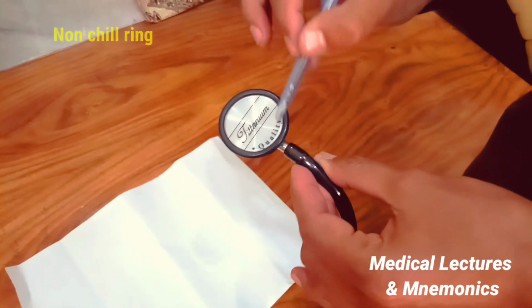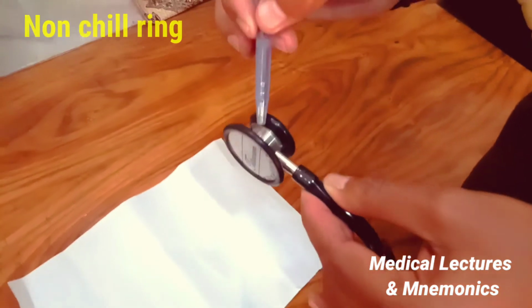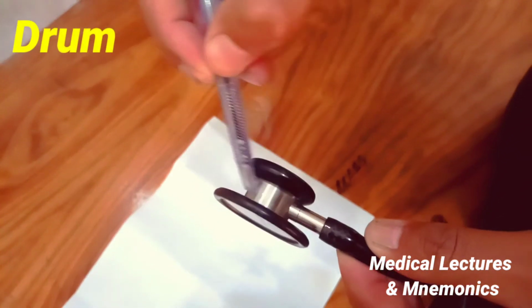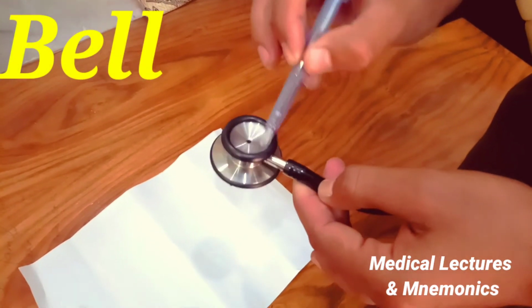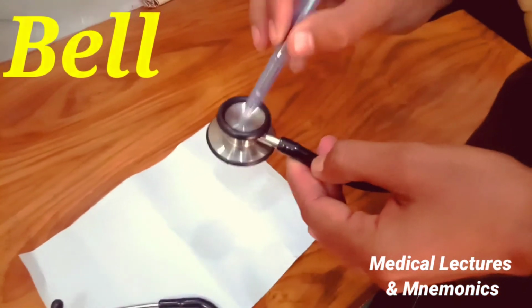This is called a non-chill ring. And this is the drum of the chest piece. And this is the bell of the chest piece, which is actually used to record the low pitch sound.